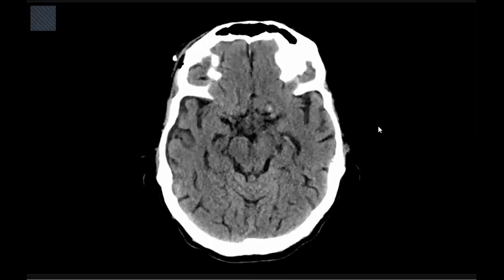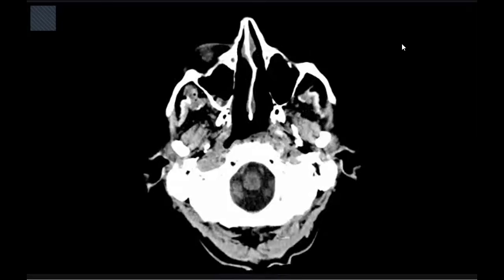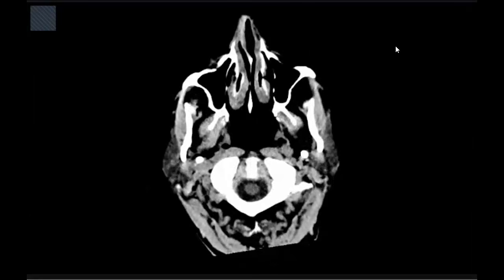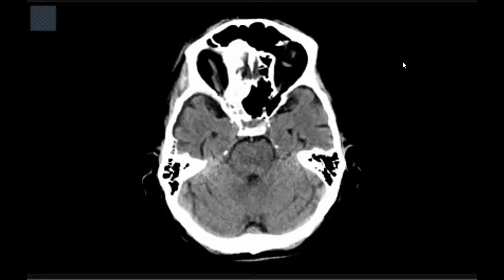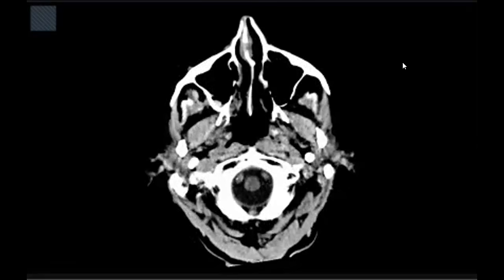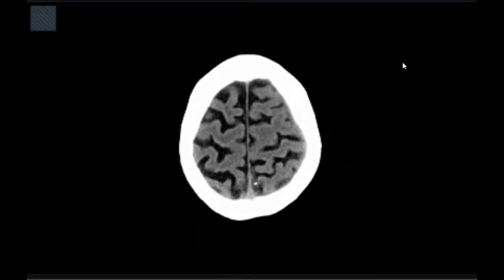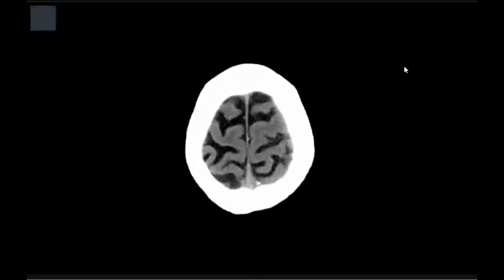This case, always try, if you couldn't find the abnormality in your first look, first of all you have to scroll. In the exam, don't scroll too fast. Scroll slowly, start from up down or down up as you like, but while scrolling, look well at what's happening.